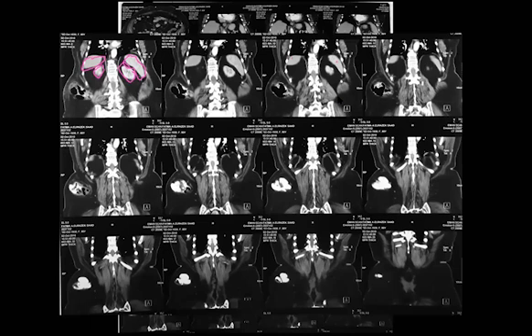يلا do you think this is a posterior film or an anterior one? Posterior. I think it's posterior.